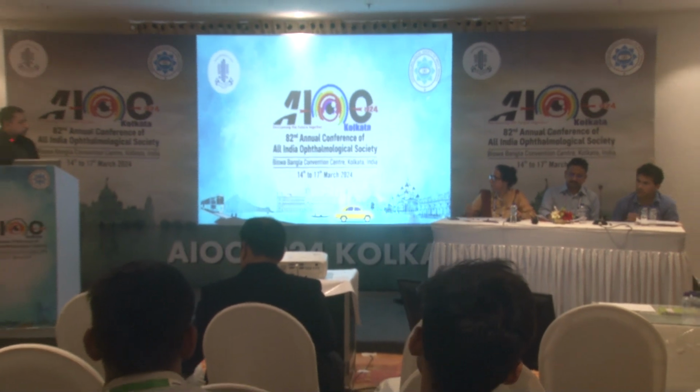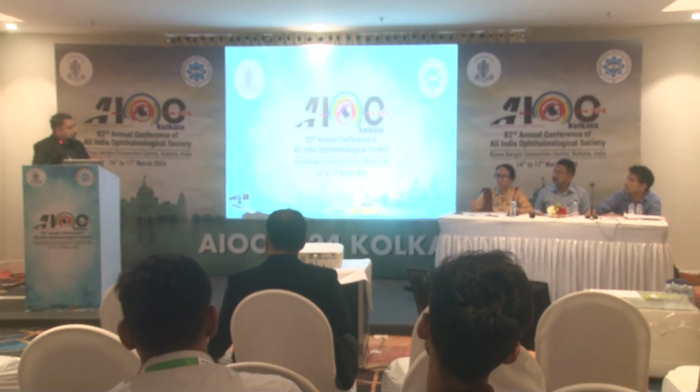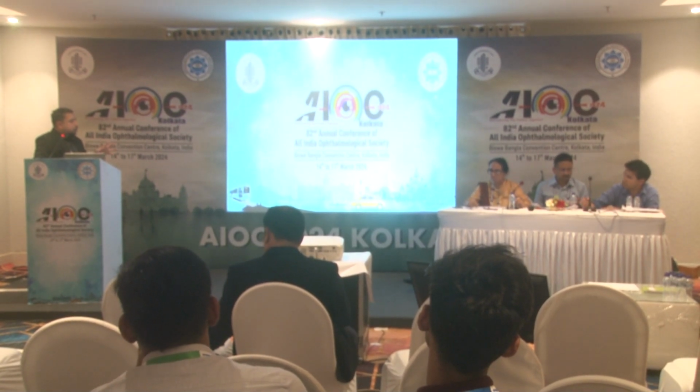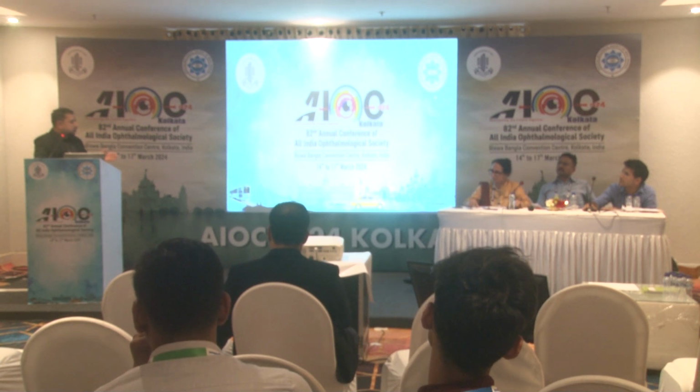Do you have any experience of treating such patients when you saw the double layer sign and you treated them? No, this is very new, madam. Even when you find the double layer sign in a non-exudative eye, you are not allowed to treat it. But the main point is that 5 to 18% of these people will convert to a full-blown CNVM in 1 year. So you have the opportunity to tell the patients that they have to have regular follow-up, even once every 3 months, with OCTA to make sure it doesn't progress.